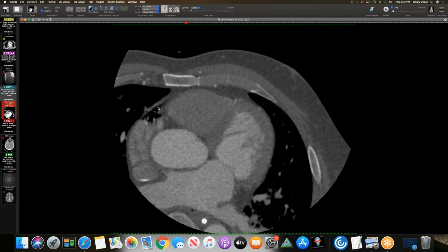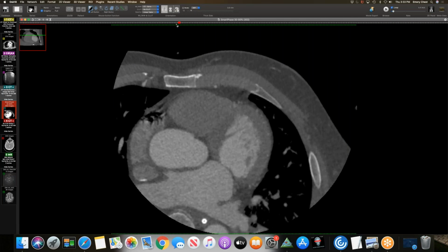We asked the cardiologist, who had done a bubble study, which was negative, and the sensitivity for a bubble study is very high. We were worried that there could be an atrial defect. So the air in the right atrial appendage is unrelated then, right? Unrelated, yeah. It's just from a venous flush or something. Yeah, and there's no shunt based on a bubble study. Yeah. Interesting.